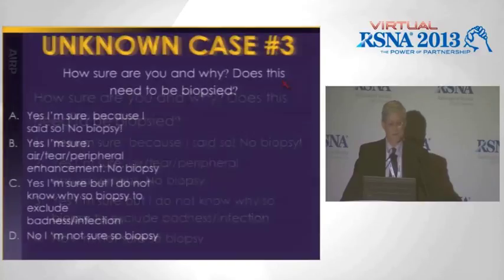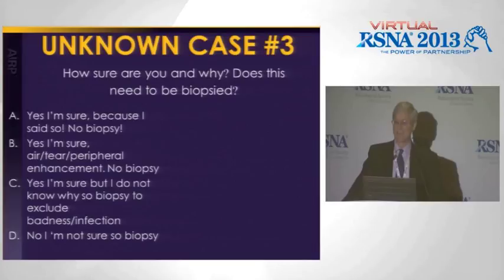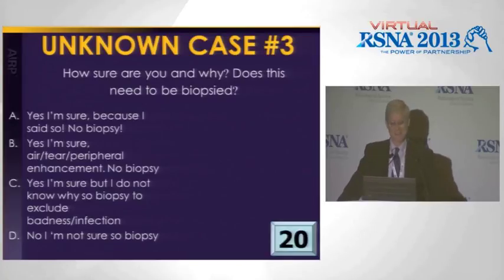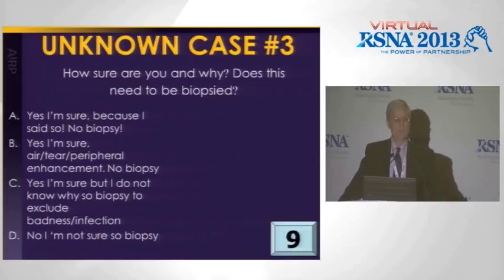There's no image here. Yes, I'm sure, because I said so. No biopsy is indicated. A classic staff answer at an academic center. Clearly, I didn't say that. Yes, I'm sure, because there's a tear and it's peripheral enhancement. No biopsy is needed. Yes, I'm sure, but I don't know why, so biopsy to exclude badness, infection. No, I'm not sure, so biopsy it.